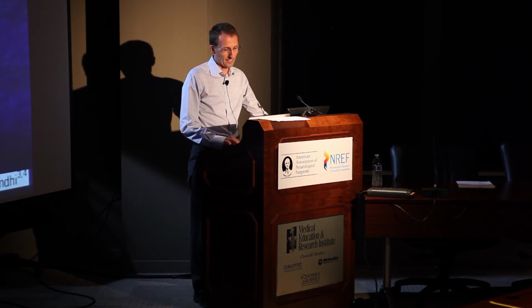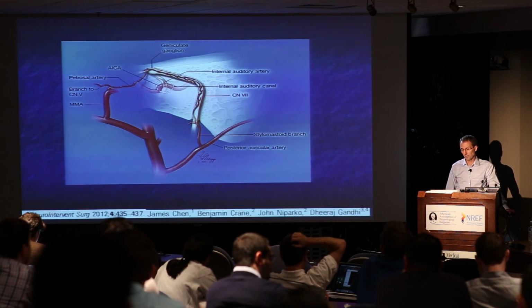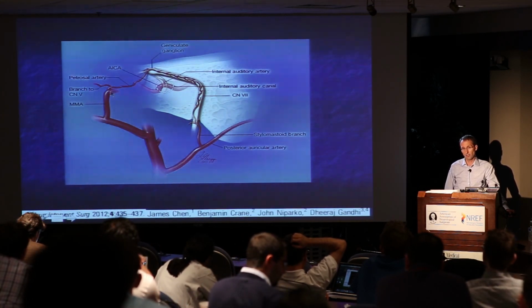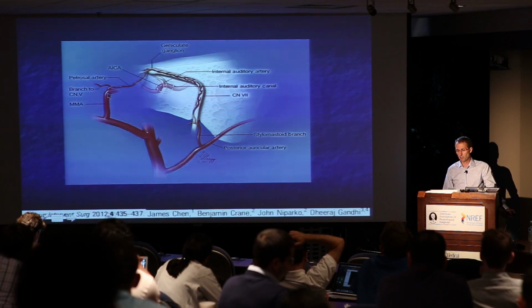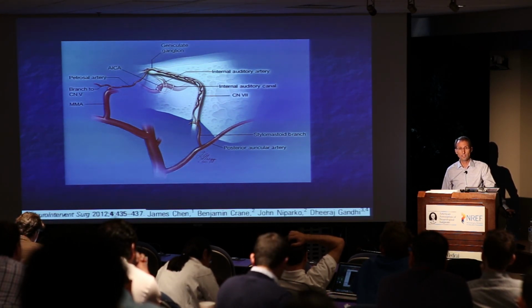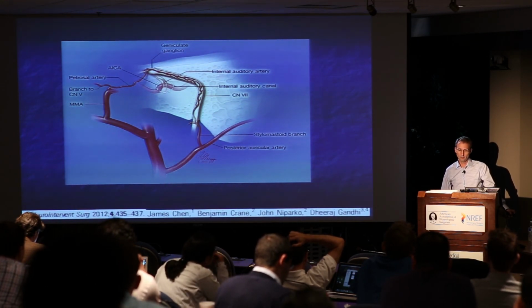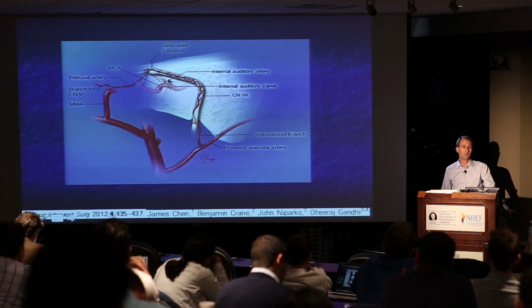But we need to, again, the MMA is one of the most common suppliers of dural fistulas. And if that supply is arising in and around this area, we need to be very careful. There's a case report, if I have time, I'll get to, of embolization of a dural fistula in this region. And the patient had a postoperative Bell's palsy that never resolved. And an institution actually tried a facial nerve decompression. It was very easy to visualize Onyx in the vasa vasorum running along the facial nerve. So this is, in my mind, a big red flag if we see supply arising in this area.